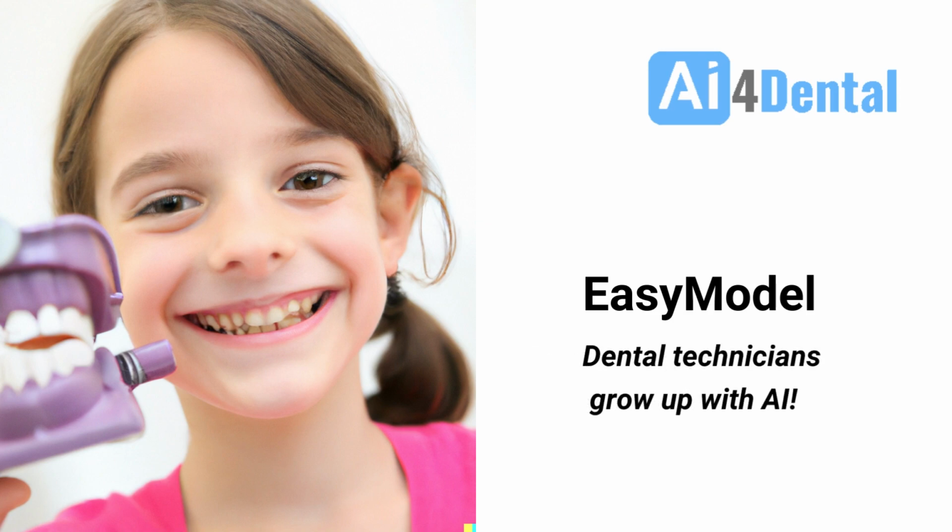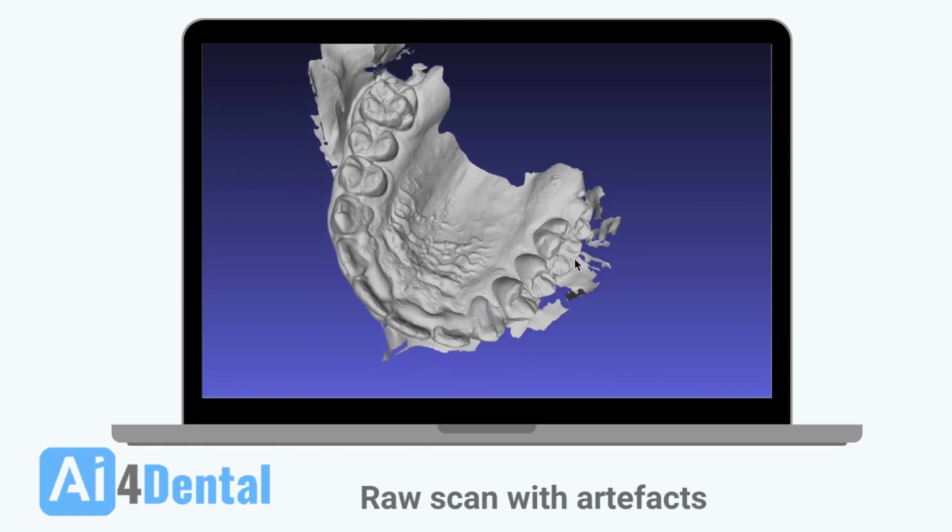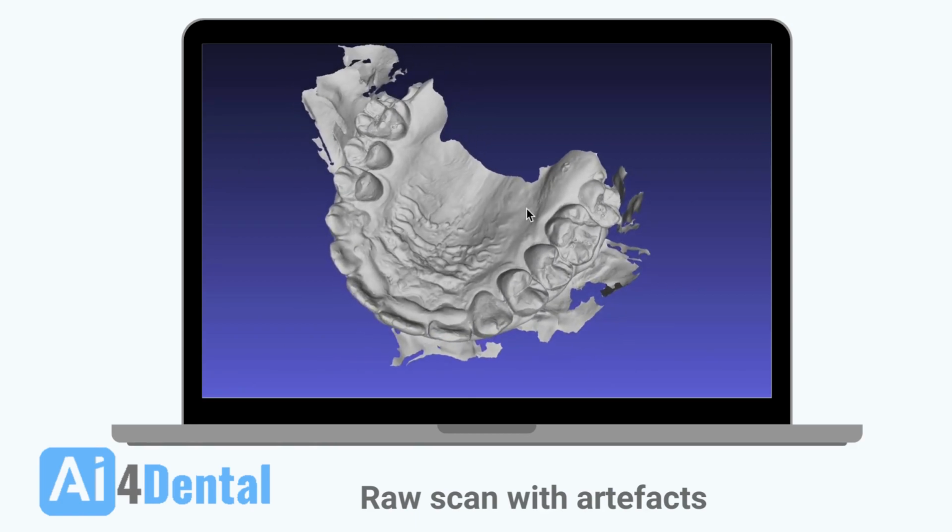Hello everyone, we are going to talk about EasyModel, an innovative tool for creating dental models from intraoral scans, proposed by AI for Dental. As a dental technician, you are increasingly asked to work digitally. You have spent hours cleaning digital impressions, making cuts, and creating supports to make models.